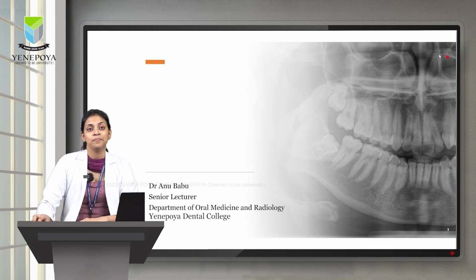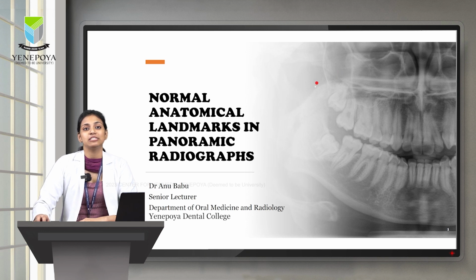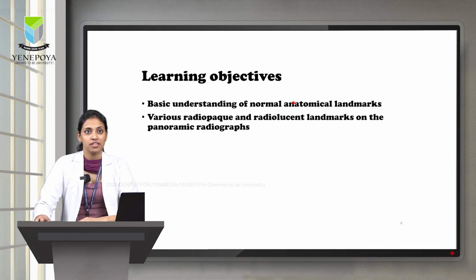Today we will be looking at normal anatomical landmarks in panoramic radiographs. Learning objectives include understanding what normal anatomical landmarks are and identifying various radiopaque and radiolucent landmarks on a panoramic radiograph.